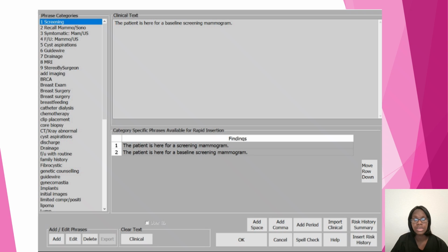So for the next screen that you'll go to, sorry if I have to jump and skip to different things, because whenever you see your PenRad, you'll probably see just a tad bit more information, but that's because of HIPAA. So I couldn't show a lot of things, but this is like the bulk of what you need to know. This will help you navigate through any PenRad system by watching this.